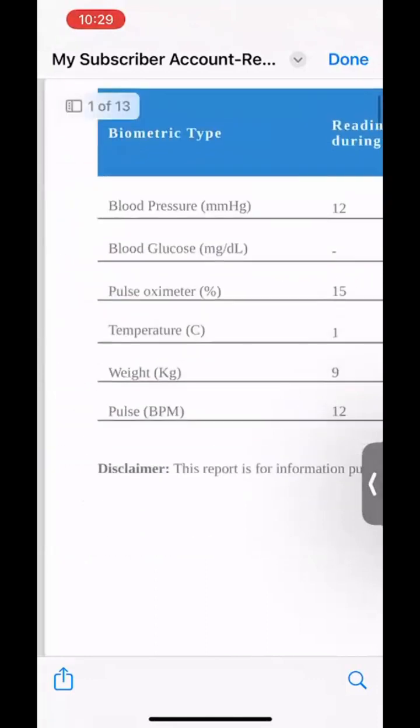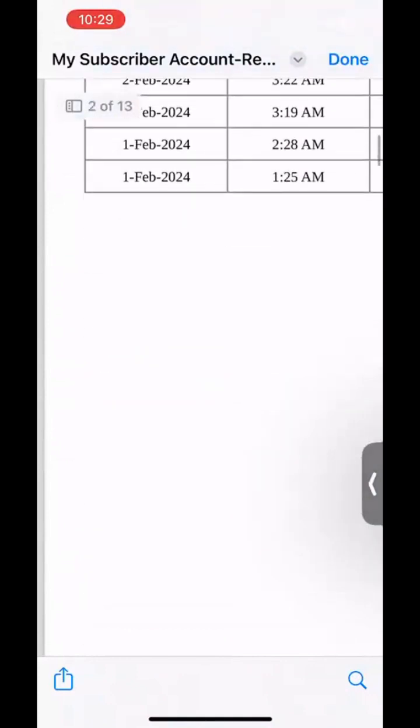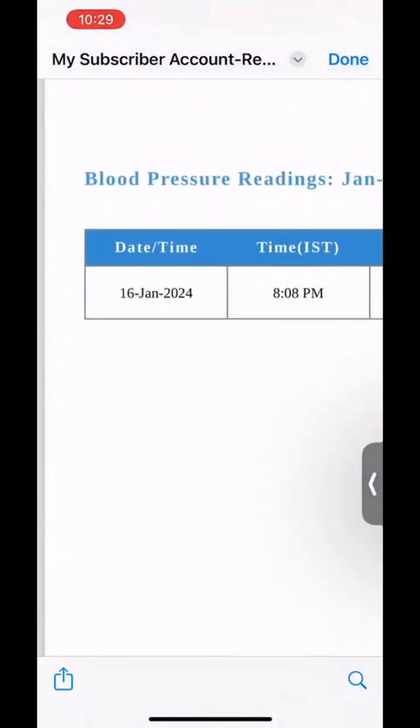Now, if you go down the report, it now gives you the daily summary of the readings that were taken month-wise and day-wise for all the parameters. Now, this is important because all the health parameters are now available in one report. And if we are sharing it with a caregiver, then he can view all the parameters on their own mobile devices. And this actually helps us tremendously because when we are consulting with the doctor or for any kind of telemedicine or even with caregivers, this is a good feature to have.